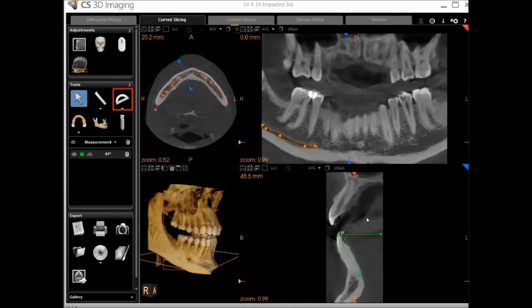As with the other measurement tools, the icon with a thumbtack over it for angles enables you to draw repeated angles without reselecting the tool.